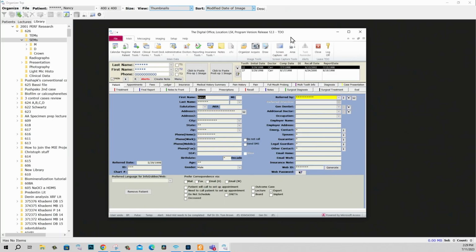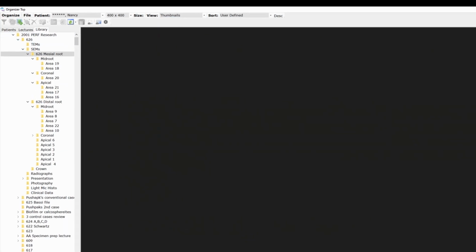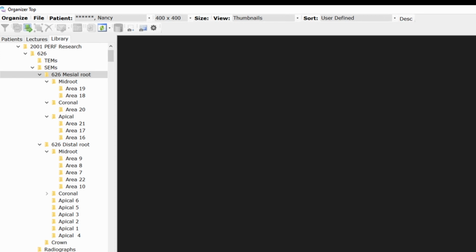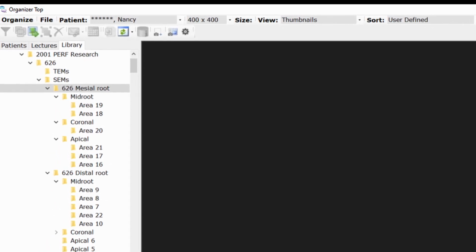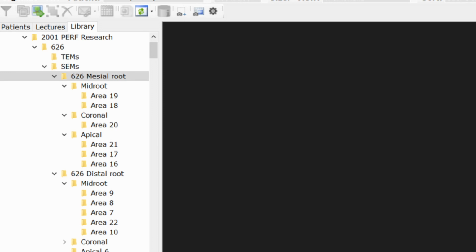Now I'm going to do an experiment and show these sections using the TDO image organizer because it makes it much easier to display many images, especially where you want to zoom in. In the TDO image organizer, the scroll button on the mouse enables zooming, and for those who use TDO, that is how I suggest you review these images. It saves a lot of time. If you don't have TDO, you have my sympathies.